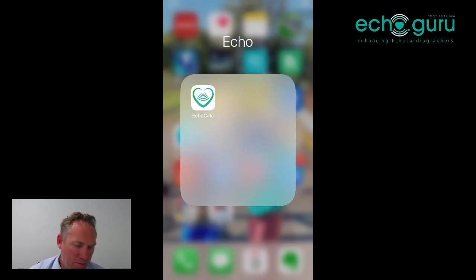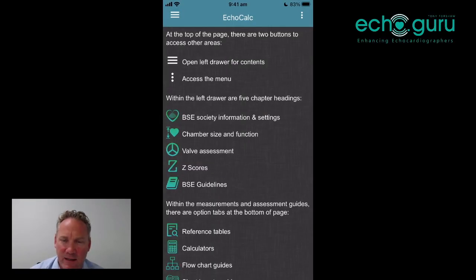So as we open the app, the first thing that we get taken into is an instructions page, which gives a bit of information about what each of the tabs do and how to navigate through the site. One of the criticisms of the application on social media is that it's a very busy site. It's very hard to read because it's just too much information there. And I actually wonder if a lot of those thoughts, especially around the difficulties in navigation, is just that people haven't read this page. So I really strongly recommend to take 2 minutes to read this front page, and everything will make a lot more sense after that.